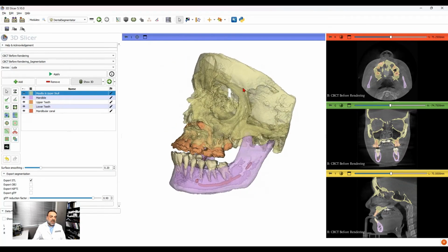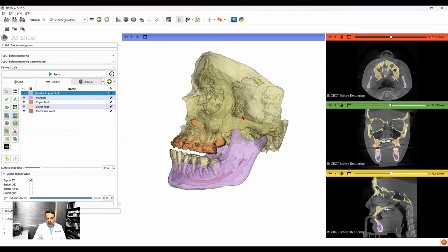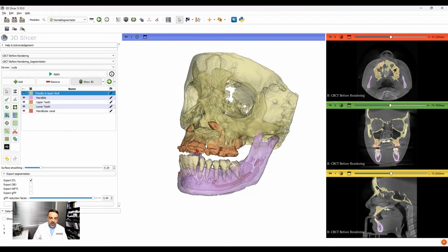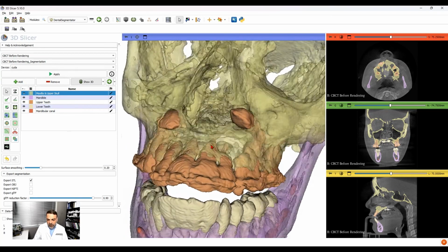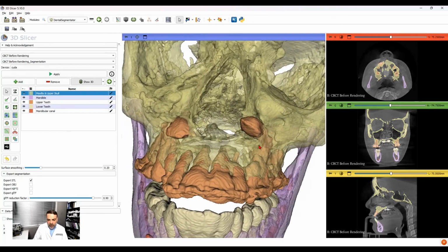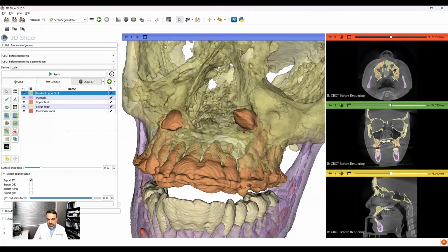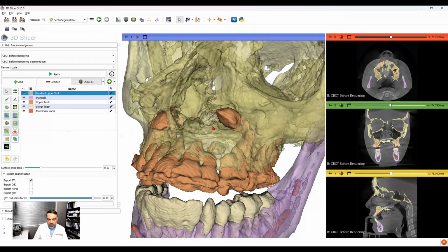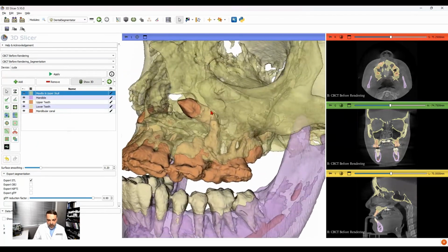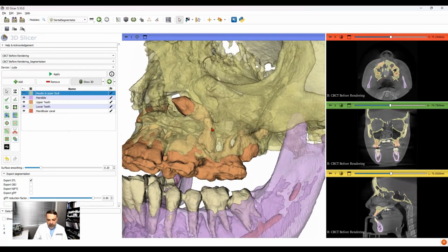I think this is excellent where you can evaluate the teeth position. This is a very hard case where you can see that the canine is right to the mesial, I'm sorry, right to the distal floor of the nose. So this is the nose right here, and then we can see that canine is right there. We need to create some clearance by letting this premolar come down, and we'll try to drop this one all the way down.